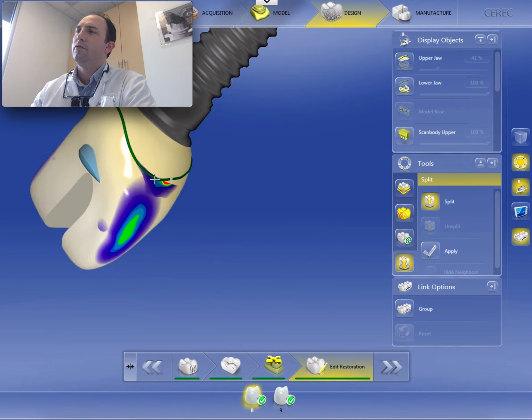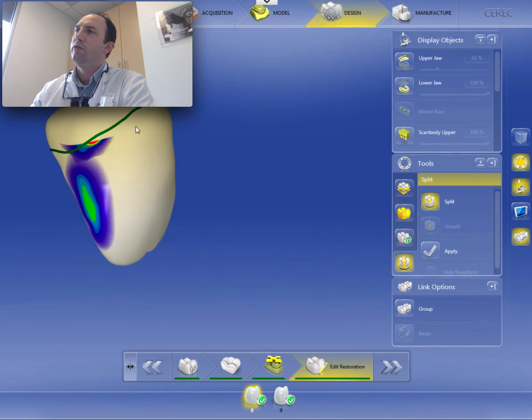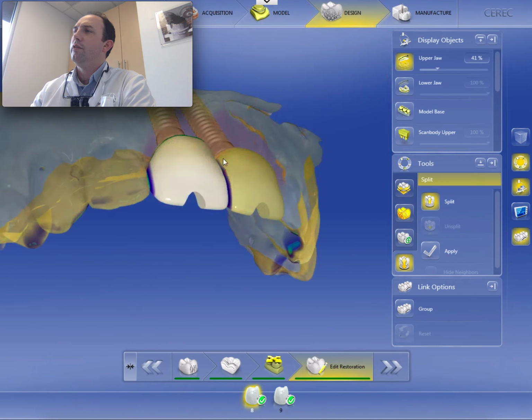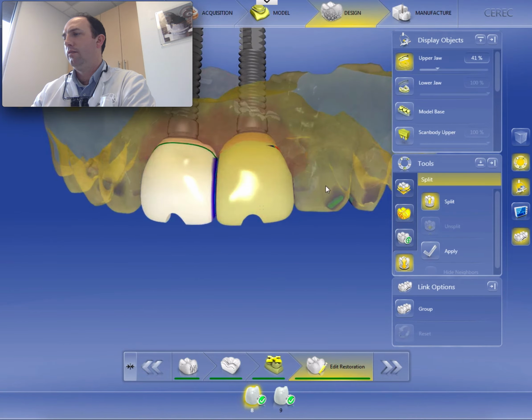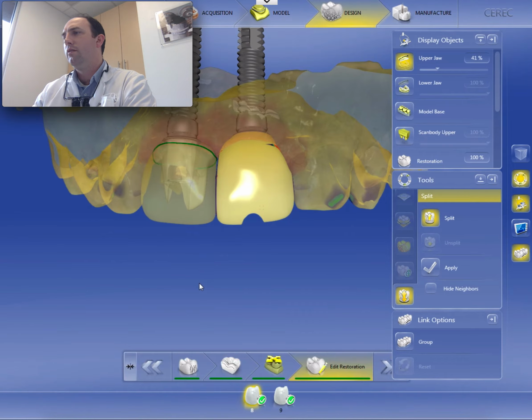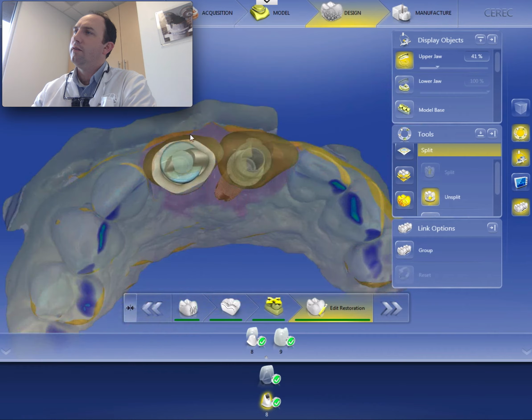Then we can actually bring this up on the lingual. I like to bring them high on the lingual, not only for the sprue, you know, but also for the cleansability. Okay, we'll get that one split. It's creating the modeling now. All right, that one looks good.